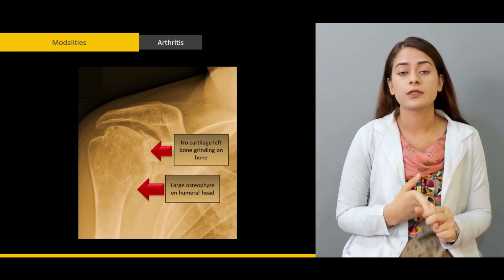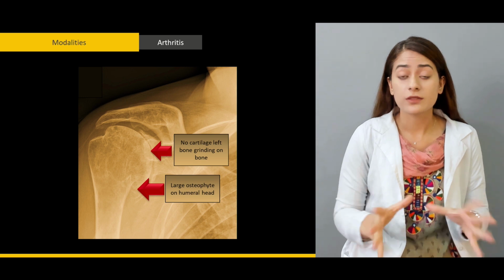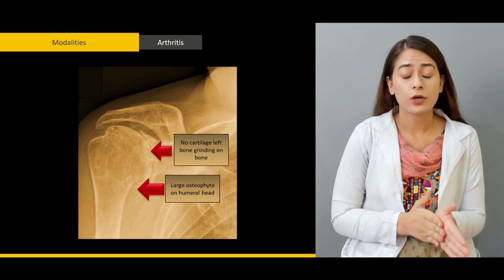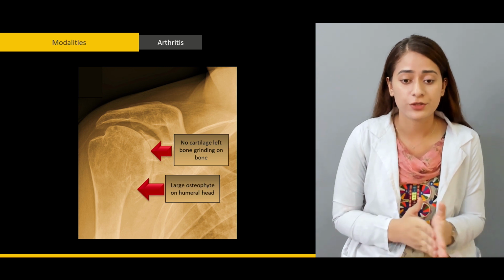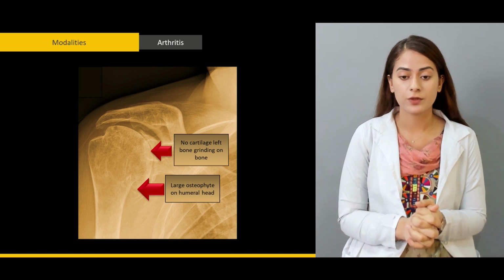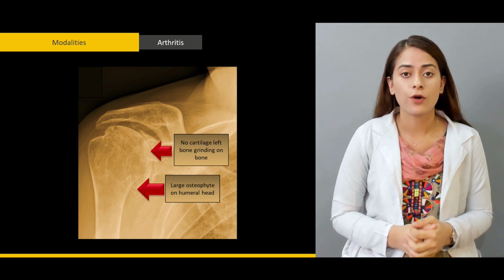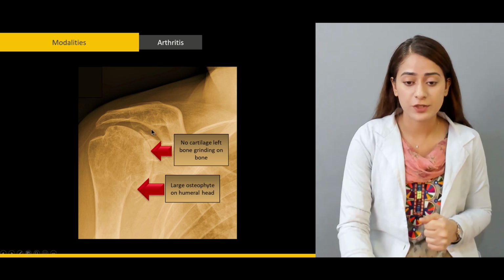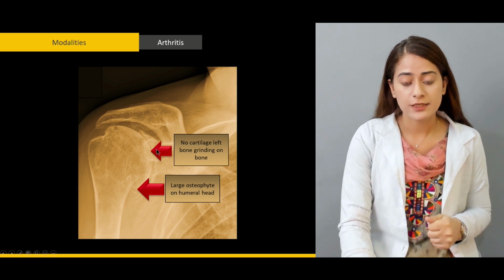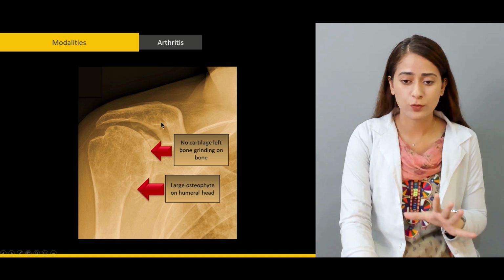Then there is the degeneration of cartilage. So all of the sclerosis, so we will talk about sclerosis in detail, how it happens, and all the osteoblastic and osteoclastic activity associated with sclerosis. So all of these are characteristics of arthritis. So what's visible here is a generalized decrease in bone mineral density, or there is the weakening of bone.